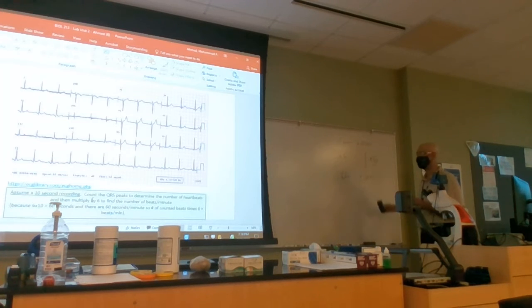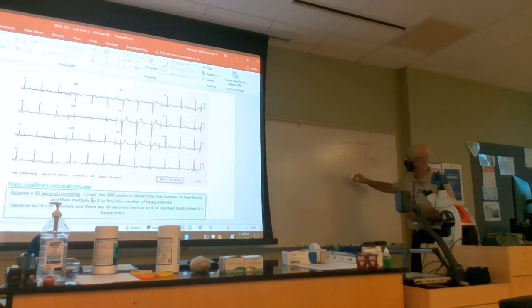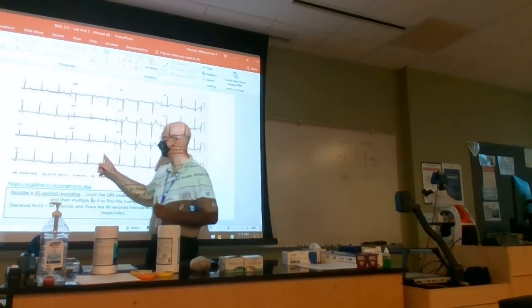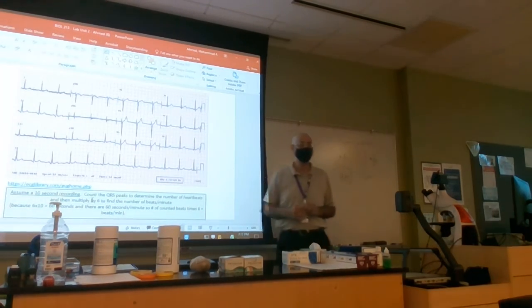And just to avoid confusion, you want me to tell you how to do it if it is 5 or 6 seconds? You want me to show you? So if you get a strip like this, and let's say you have counted, let's count them. How many are there, guys? 1, 2, 3, 4, 5, 6, 7, 8, 9, 10, 11, 12 of them, right? What's the heart rate for this person?